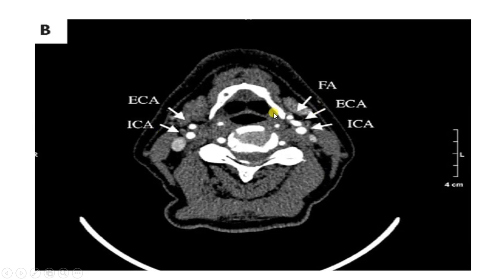And this is the arterial structure, and we have to differentiate the arteries from the lymph nodes, as the arteries are more radio-opaque, and according to the size of the lumina, as the larger common carotid artery has greater size.